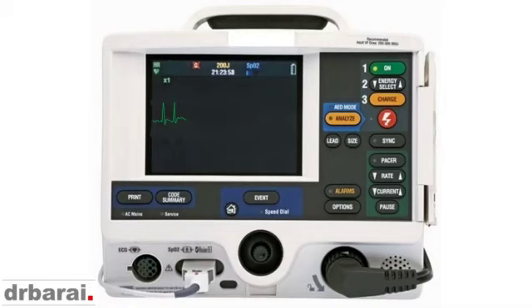In case of atrial fibrillation, we need to identify a lot of things: patient features, demographics, previous histories, is there any thyroid disease, is there any electrolyte abnormalities, and then we need to find out should we do the synchronized DC cardioversion or not. This particular 56-year-old gentleman did not have any structural heart disease. He is otherwise fit and well, normal thyroid function, and the onset was just 10 hours earlier. We have given anticoagulant, and we perform a synchronized DC cardioversion.